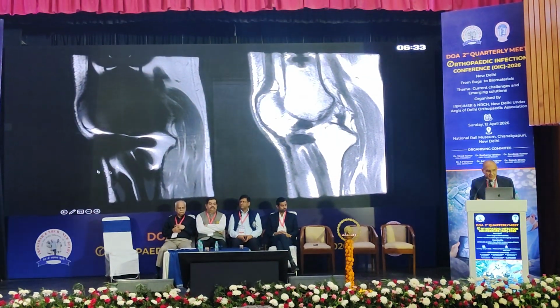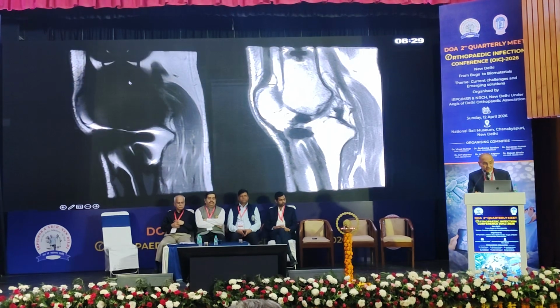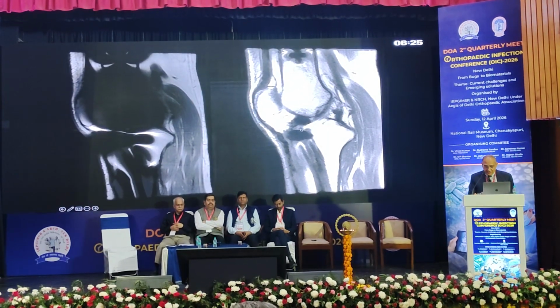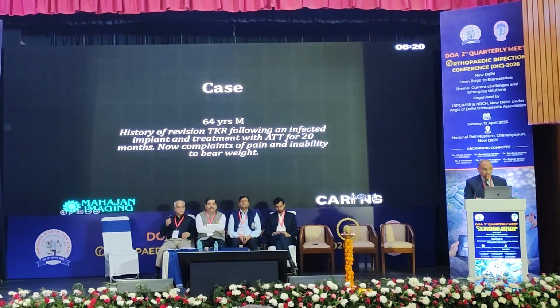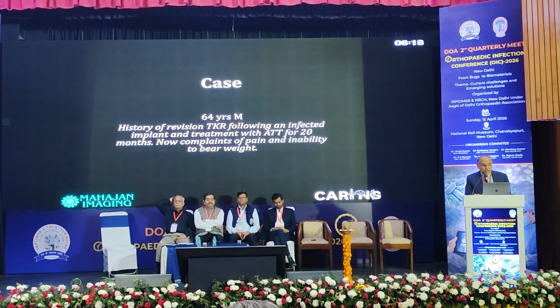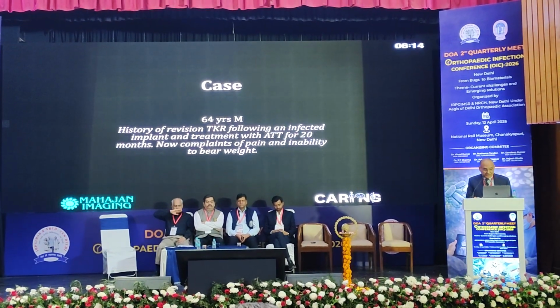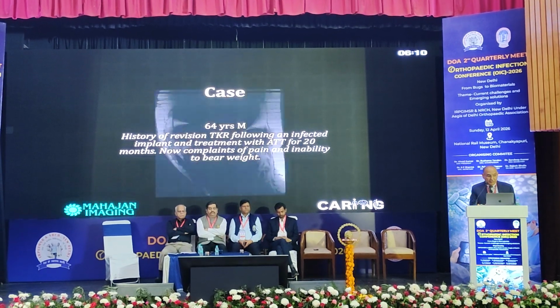Another example, just to highlight the fact as to how useful MAVRIC is, that's standard MARS, and this is MAVRIC where you start seeing all the details around the knee joint. A 64-year-old, history of revision TKR following an infected implant and treatment with ATT for 20 months, now complains of pain and inability to bear weight.